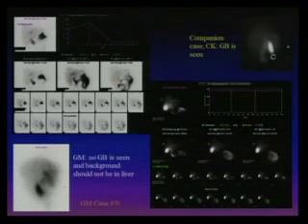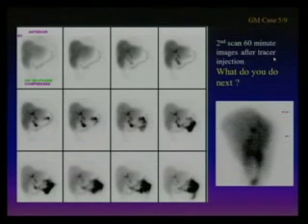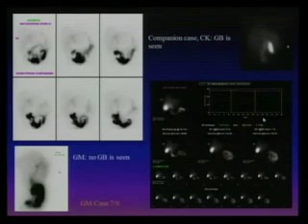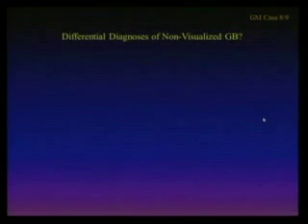So I said, okay, call the patient back for a second scan the following day. And they still have some tracer left in the bowel. And then we again say this is the CBD and duodenum. Lateral view, no gallbladder. And then we give morphine. Still no gallbladder shows up. And then we report cystic duct obstruction, and the patient went to surgery. So they found this cystic duct obstruction, with chronic cholecystitis. But that's how you work it out. If you miss the gallbladder, or think that's a gallbladder, you completely make the wrong diagnosis.